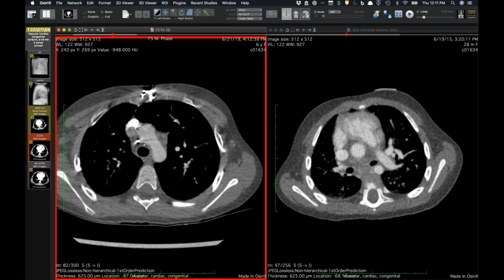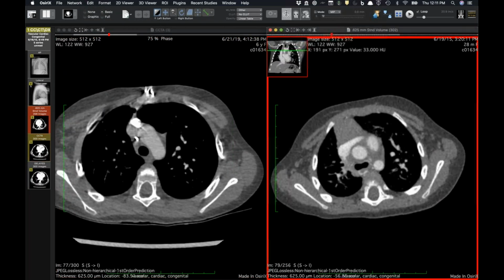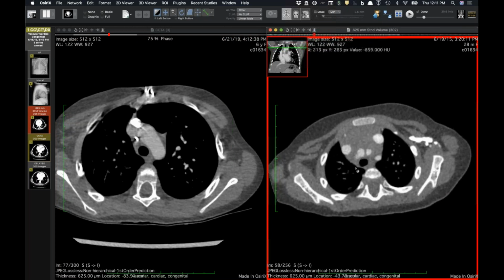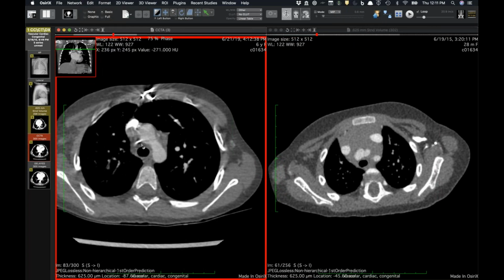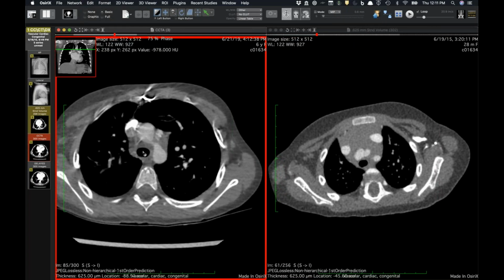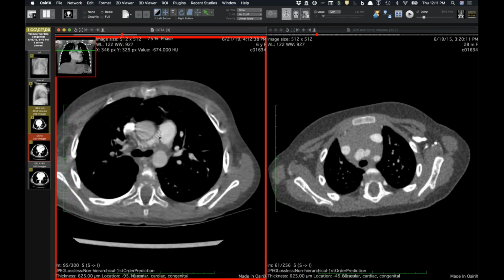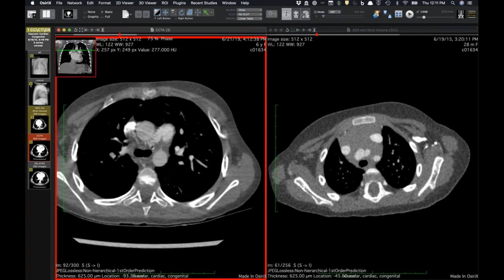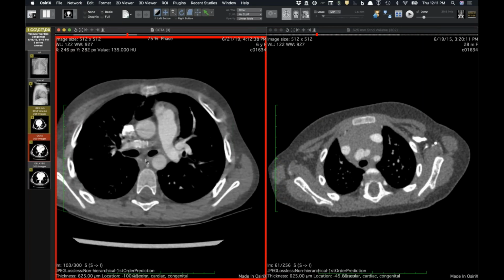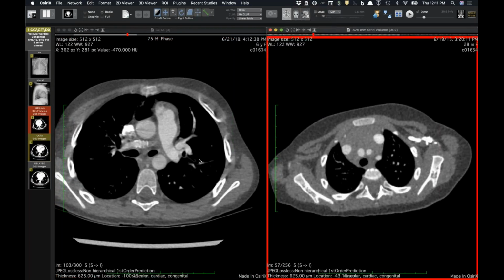And when looking through the surgical note, sure enough, that little nubbin that we saw up here on the prior study right here has been ligated, and that was the remnant of the ductus. So that was the ligamentum arteriosum on the right. So it's kind of like several cases just showing where these proximal interruptions of the pulmonary arteries arise from and how they develop. But this is the first one I've seen repaired. We actually have another patient that was repaired elsewhere that's been referred to us, a young patient as well.